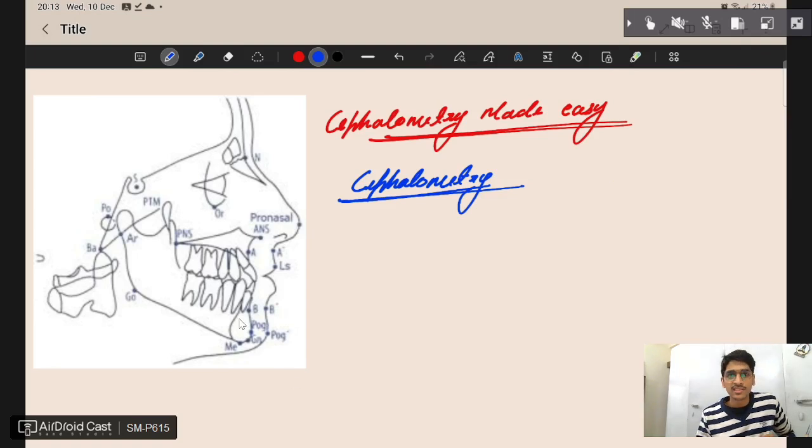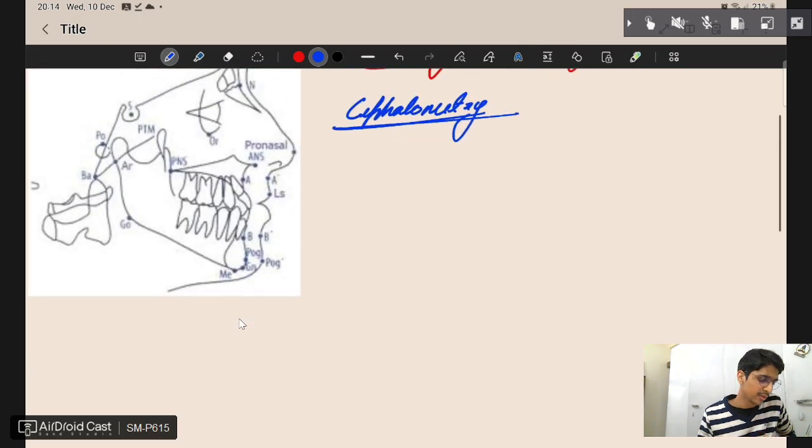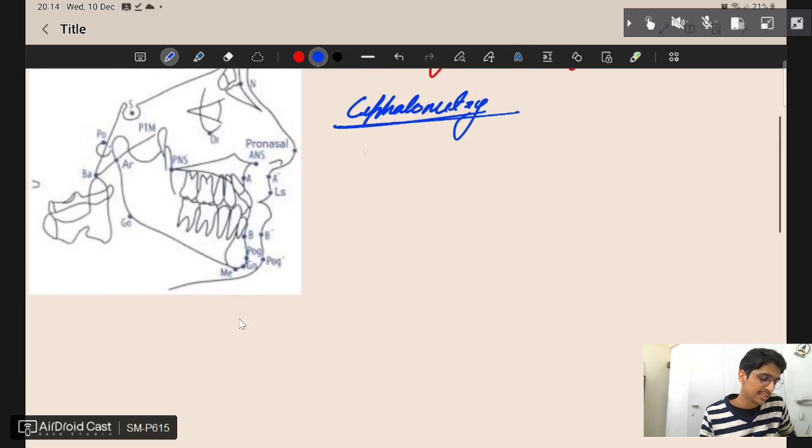I am Dr. Abhish Chasthana and I will be teaching you cephalometrics today. What we are going to learn in this lecture is the various types of anatomical landmarks and along with that the analysis. In the analysis, we will be covering in detail Steiners, Tweeds, and Downs.